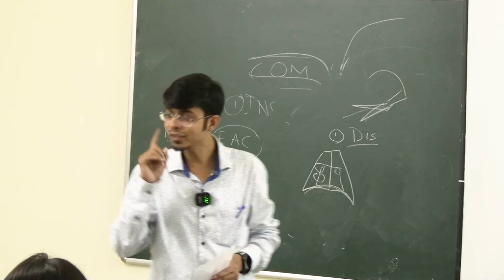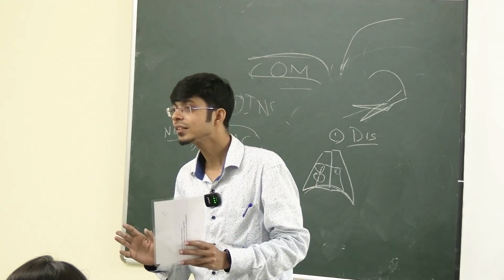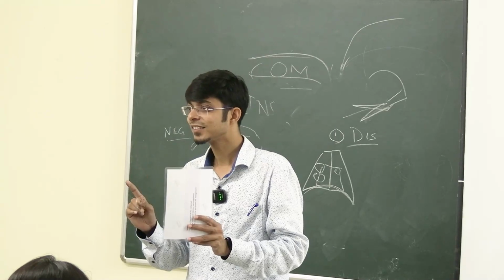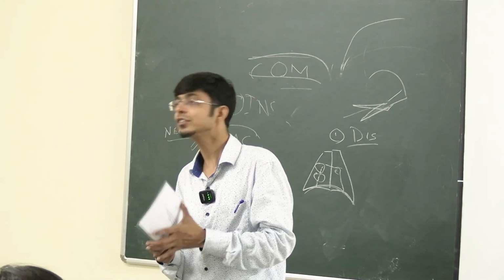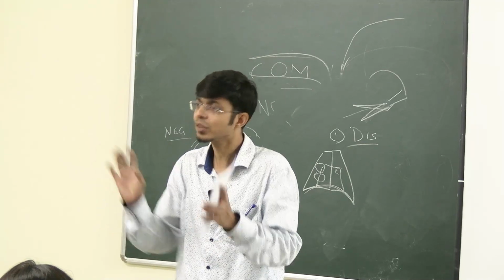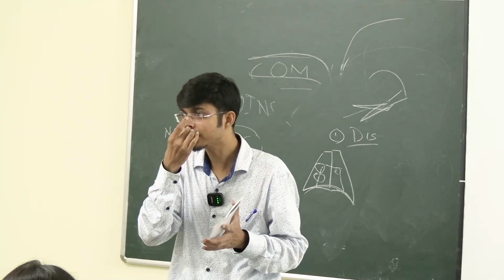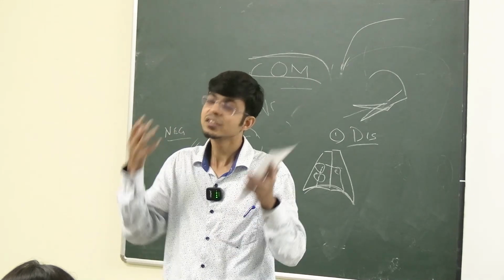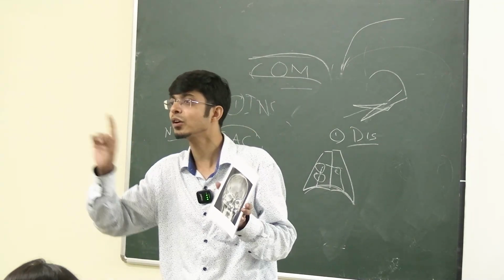Little's area is a mucosal structure. Is it a bony thing? What is Little's area? It's the junction of the arteries. Is it a bony place? No, so how will you appreciate Little's area? It's not a bony structure. Little's area is a vascular space. It's a soft tissue, right? Anterior inferior part of the septum. It's a cartilage, soft tissue. There is no bone involved, so you cannot see it on X-ray. Don't comment on something that you cannot see on X-ray.